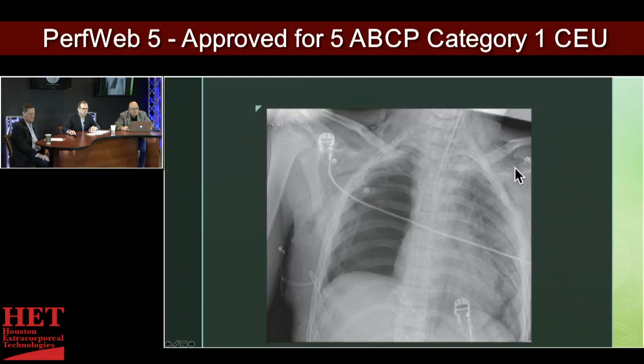So this patient probably has had a traumatic injury, or they've had a line insertion that went bad or something along those lines. Anesthesia, again. Again, that's anesthesia, and the surgeon has fixed this. This patient came in respiratory distress, and they got intubated. Now we're starting to look at these other midline soft tissue structures, and then the lungs, and then we'll get to the lines. There's obvious discrepancy between the left and the right lung fields.